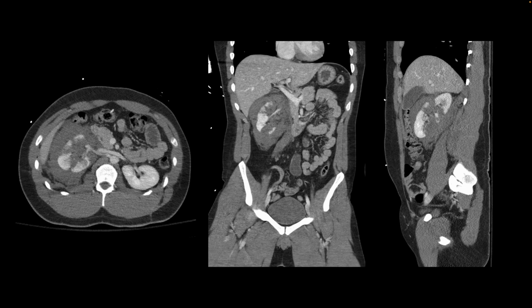These are images from a CT scan of the abdomen and pelvis performed in a young patient who presented after trauma, and we can see that the problem is in the right kidney. And whenever there are structures which are bilateral, always look at the other side to see what the normal looks like. So this is their left kidney, and look at the right kidney. There is this large hypodensity around it, so that's a hematoma.